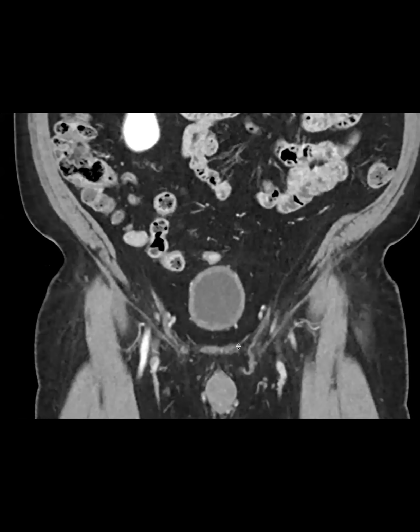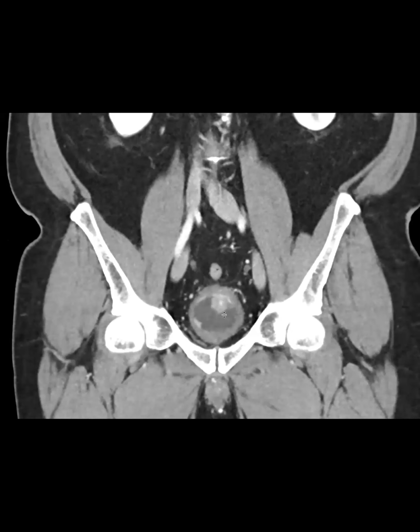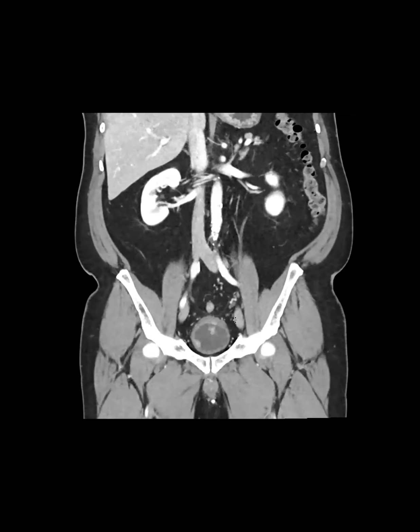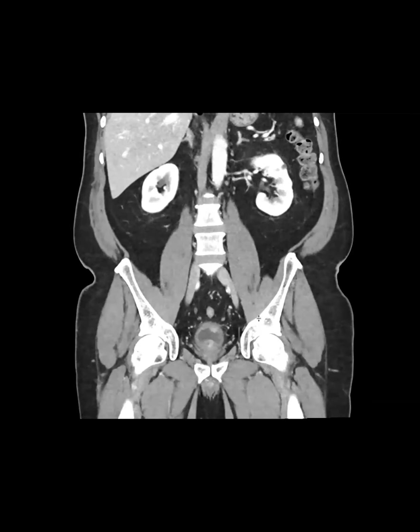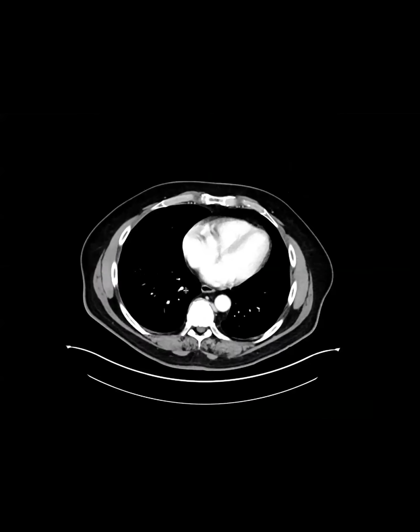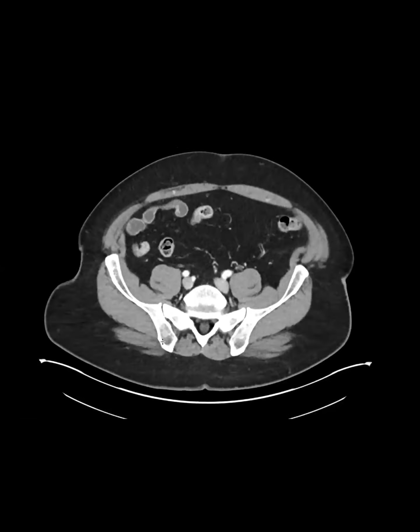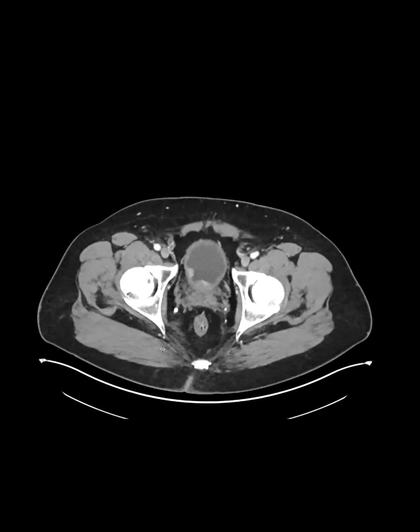And there are papers that say that basically the nephrographic or venous phase is as good or superior to any excretory phase, except, and that's not for urothelial cancer, but if it's just a hematuria case, you do best with the morphology of the intrarenal collecting structures on the excretory phase. You can't really do that without a good excretory phase.